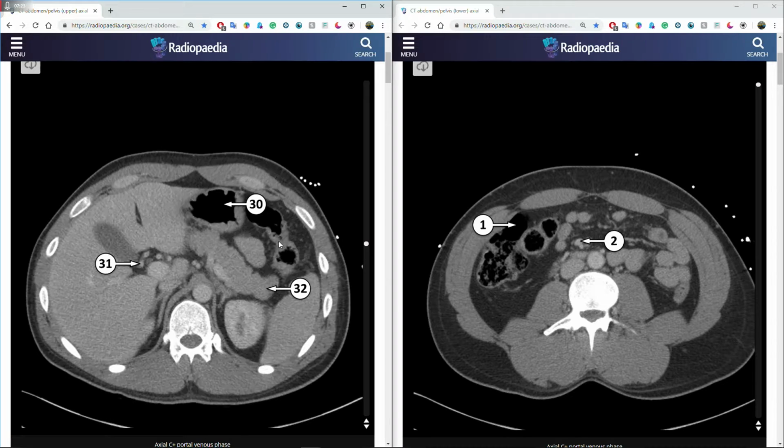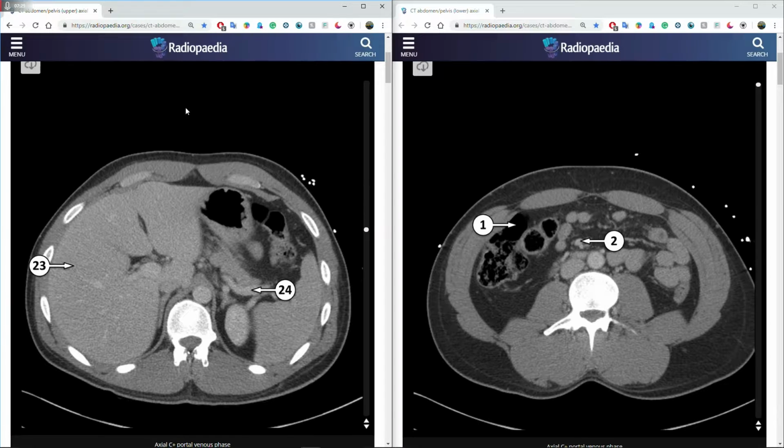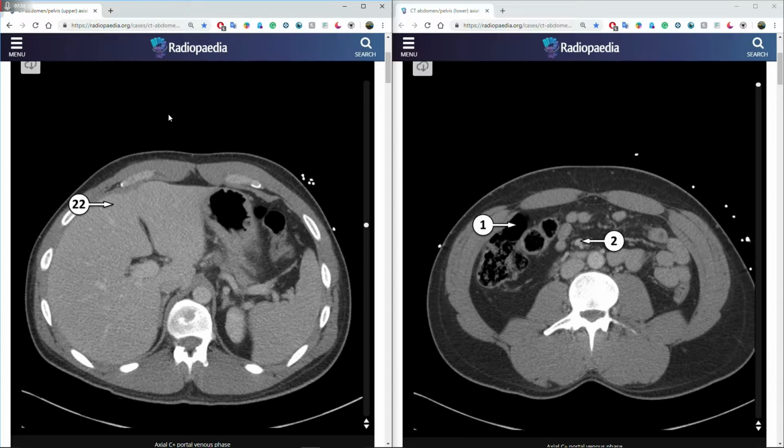If you remember your transverse colon, where this is the left and this is the right side, the right side joins with the ascending colon and the cecum, and the cecum joins with the ileum of the small intestines. Wrapping around is the descending colon, which adjacent to it posteriorly is the sigmoid colon, which goes down to the rectum.